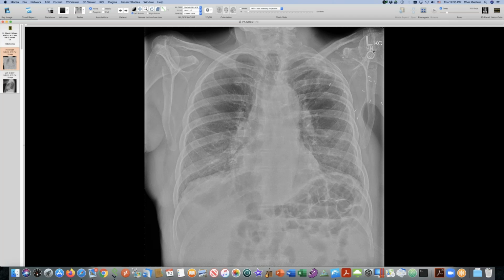The situations in which I've seen this, you don't see it very often anymore, are the old-fashioned breast cancer radiation that would be aimed through and through at axillary lymph nodes and then supraclavicular nodes. So you see again this regional bone necrosis involving the bones near the apex of the chest, but all the way from anterior to posterior.